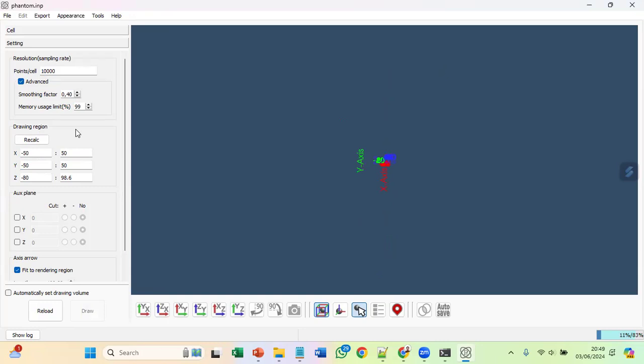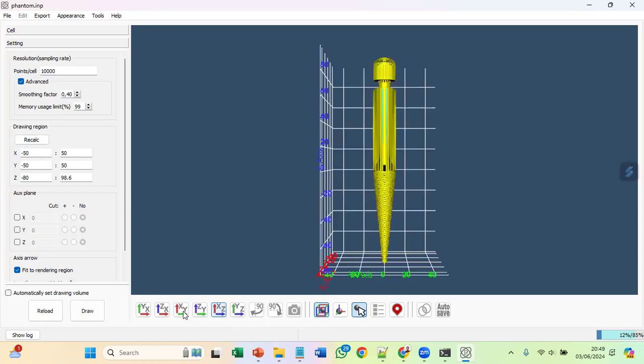Yes, in this left region, you can see there is an x maximum and minimum. You can just set it to -50 and 50 like this, and you will get this tiny whatever that makes us confused. But it's actually quite simple. Just click this.